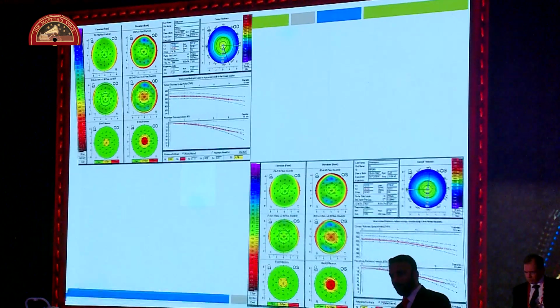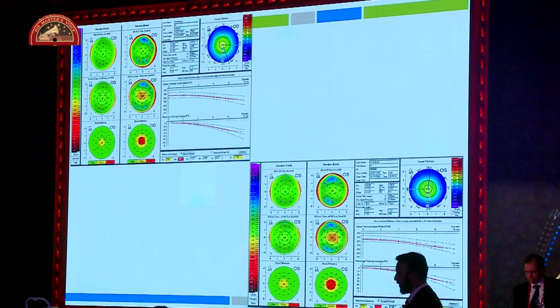Interestingly, Pentacam also shows something else here, called the Belin-Ambrosio Enhanced Ectasia Display. Bearing the long name, what it means is we remove some part of the central corneal data and then refit the elevation based curve there, and then look at whether there is any enhancement of ectasia.